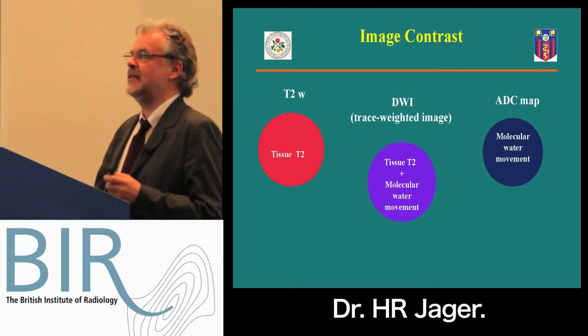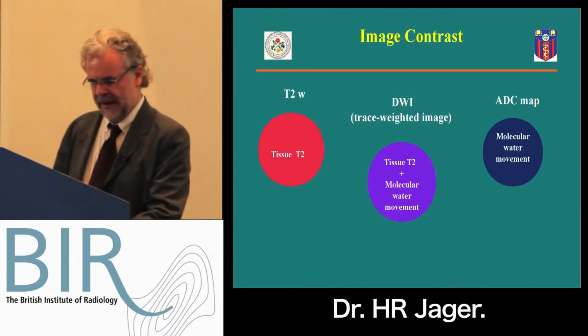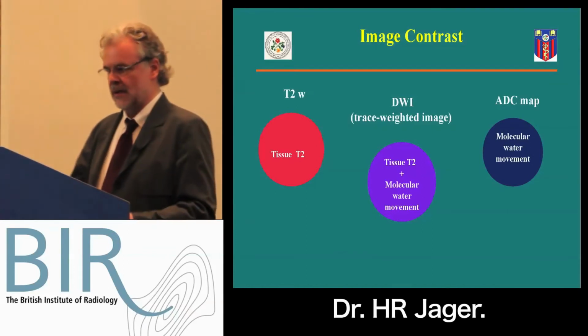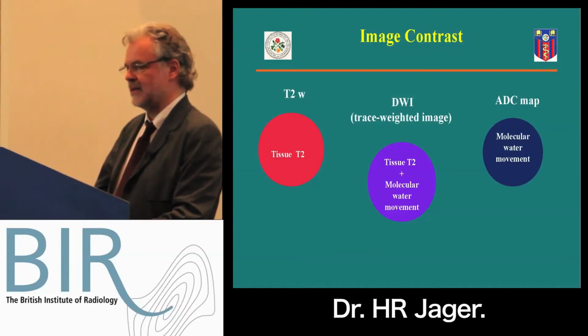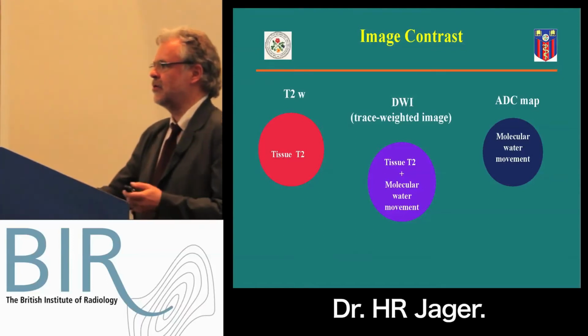The diffusion-weighted image, which you always look at in clinical practice, has actually both effects. It's dependent on the T2 and on the water movement. And therefore, you can have artifacts like T2 shine-through and T2 masking. Let me show you what I mean.